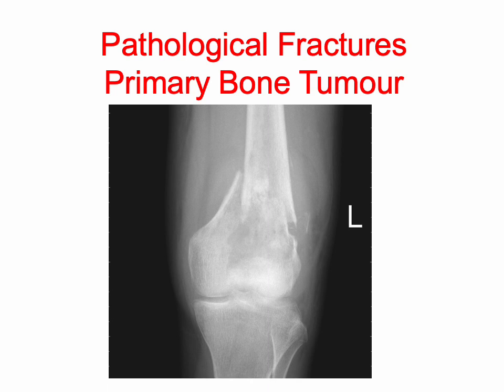So there are a huge range of primary bone tumours. Your differential really changes between pediatrics and adults, and depending on location. This is an example of an osteosarcoma with a pathological fracture that's medially displaced and angulated.